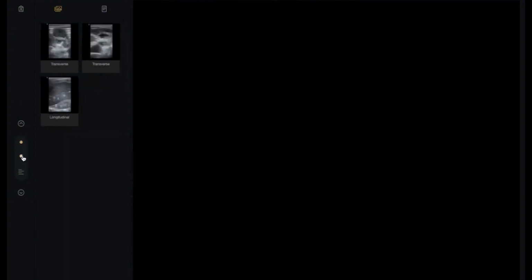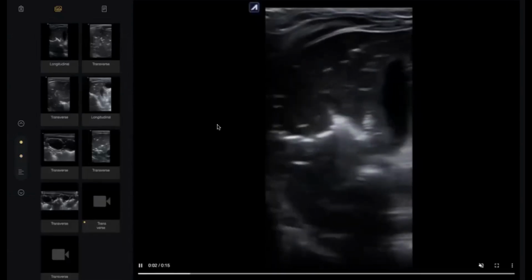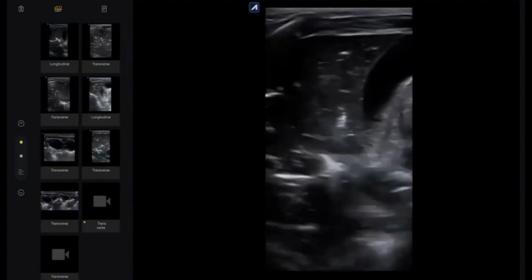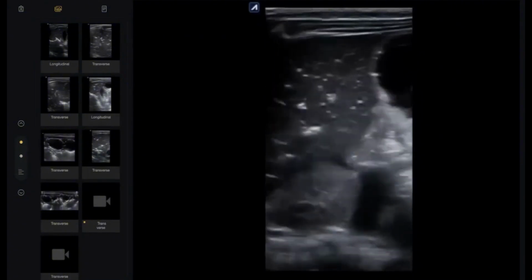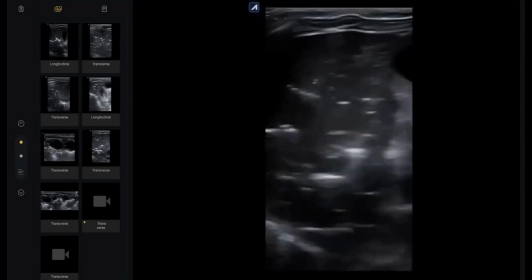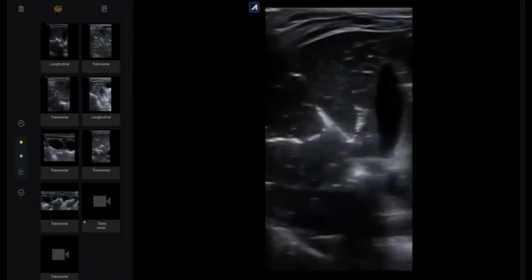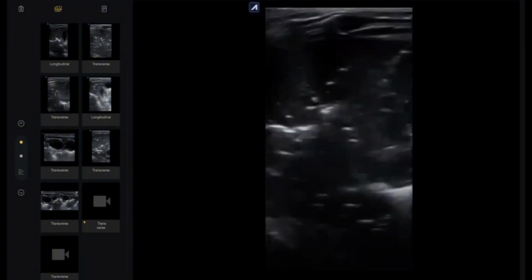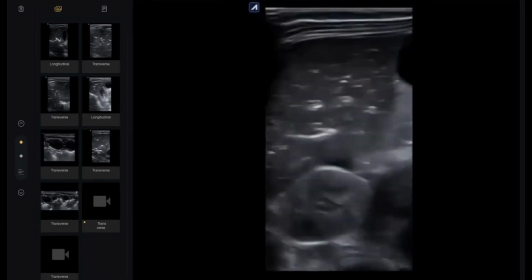The gallbladder appears grossly normal. Okay, what's your differential? Some differentials are portal venous gas and pneumobilia. Most likely, this is portal venous gas because the foci are extending up to the periphery. Most likely, this occurs secondary to necrotizing enterocolitis, which then extends into the liver.